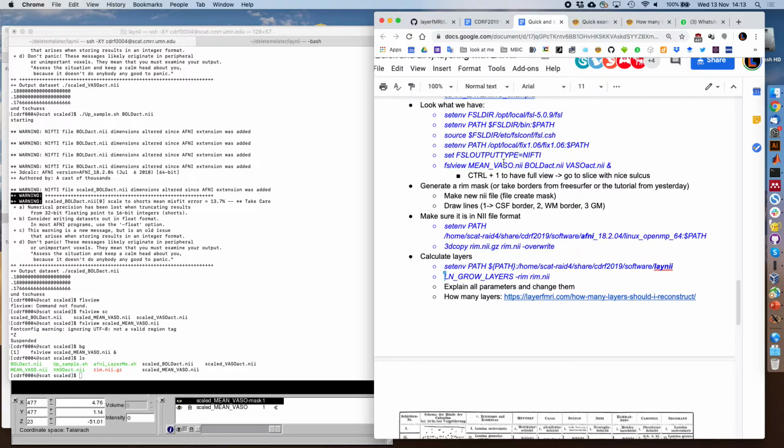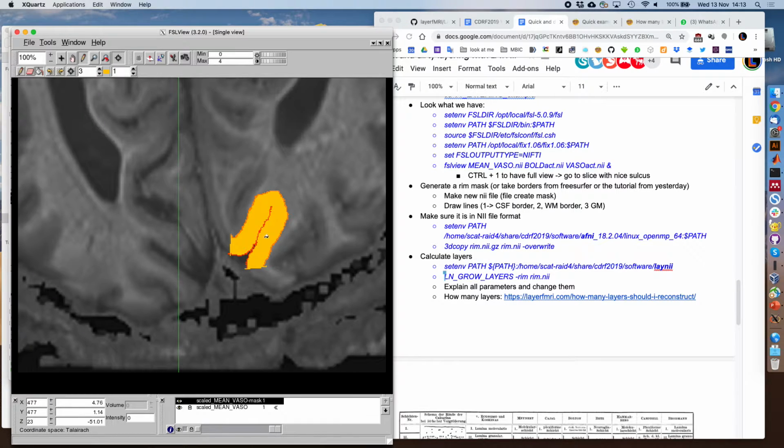Now I want to show you how BOLD and VASO are different. So whatever kind of bias we have, it's similar in BOLD and in VASO, or in task condition A and B. Of course, later you want to have proper boundaries. Right. No, it just didn't seem as if. Anyways, it doesn't matter so much. Here the accuracy was kind of bad. On the interior, somewhere here. It's okay. Yeah. And there was also a delay, right? You drew, and then it kind of interpolates into chunks. Okay. Usually we should focus better on a good boundary.